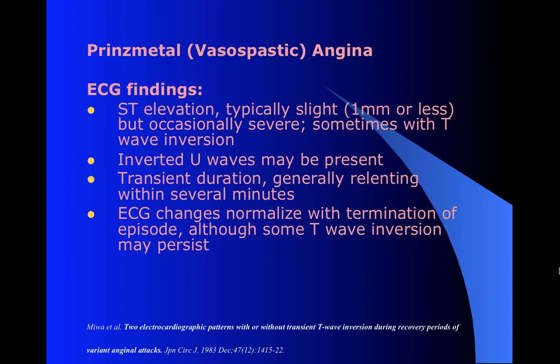Often some elevation, but usually very little. Occasionally there will be significant amounts. I've seen up to maybe 5 millimeters, but that's pretty rare. Maybe some T-wave inversion. Occasionally you'll see inverted U waves. That's kind of an unusual feature. But the big thing is that it's transient. Usually it lasts only a few minutes long. And once it finishes, EKG changes should diminish as well.